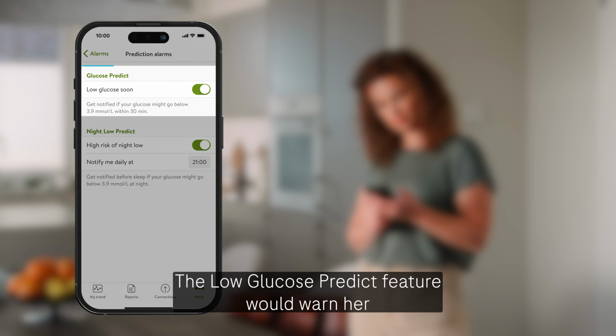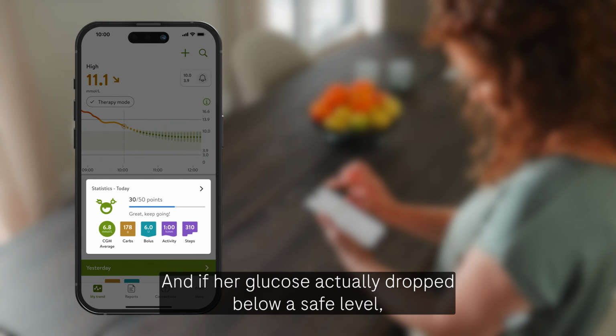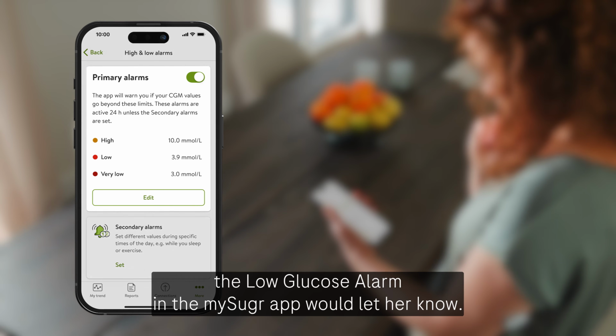The Low Glucose Predict feature would warn her if low glucose is likely within the next 30 minutes. And if her glucose actually dropped below a safe level, the low glucose alarm in the mySugr app would let her know.